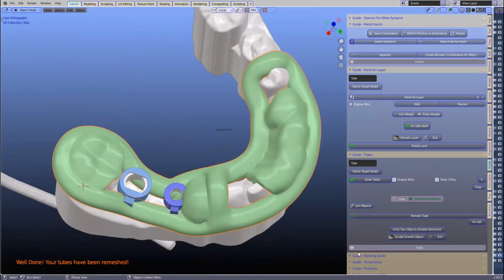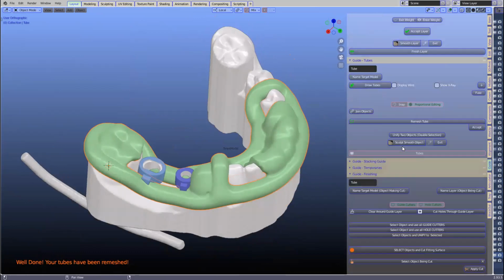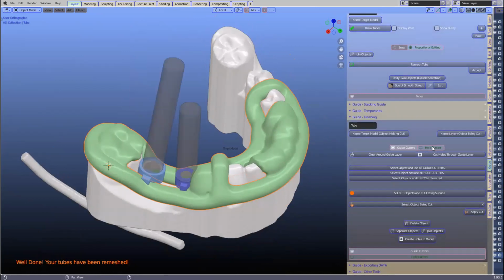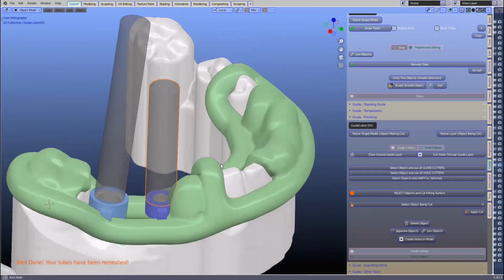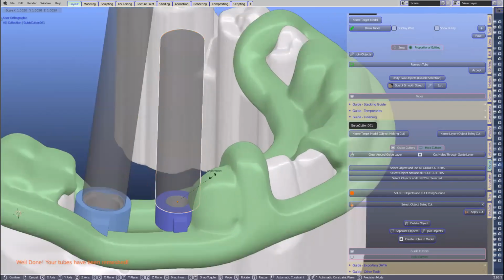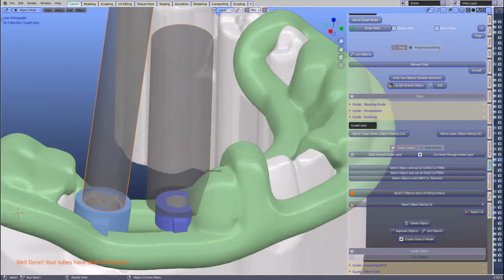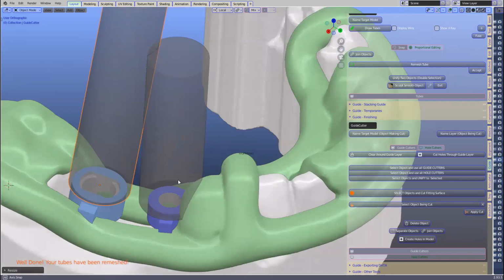All right, we go to finishing. Now in the finishing, we've got guide cutters and we've got hole cutters. Now the guide cutters, we're going to select them and we can expand it. So S to scale, make yourself enough room for your surgery. Here, we don't really need to expand much. We can nick off that little bit over there if we want to.